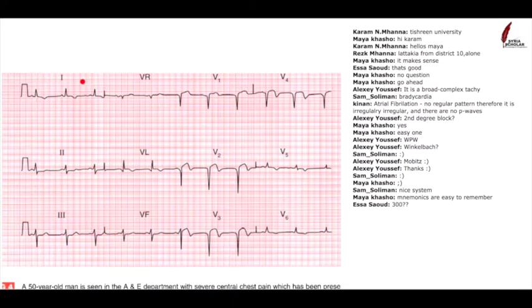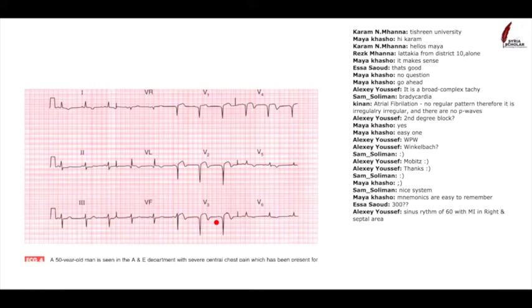So let's start. What's the first step that we're going to do? Somebody type to me, what's the first step that we'll look at on the ECG trace? Okay, so you're all not going to answer. Fine, we're going to have to do it a different way then. Step 1 is the rate. We look at the rate. I'll put up a poll. What's this patient's heart rate?